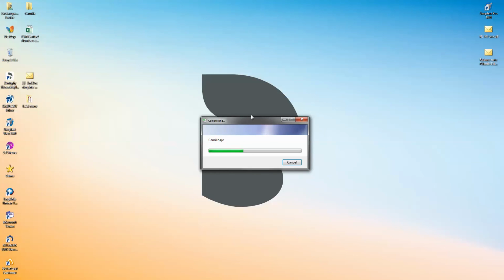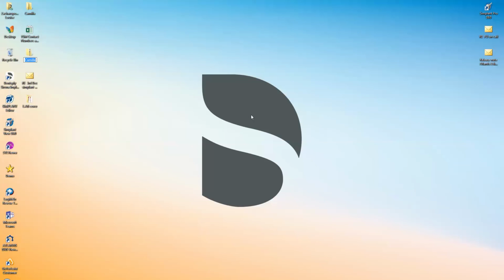If you don't rename it and you try and create another distribution view of another case, what happens is that the title of the files are exactly the same and it could actually replace your previous distributed file of another project. So instead of allowing it to override, just make sure you always change the name of your cases after it's been distributed so that the next time you do another one it doesn't override.